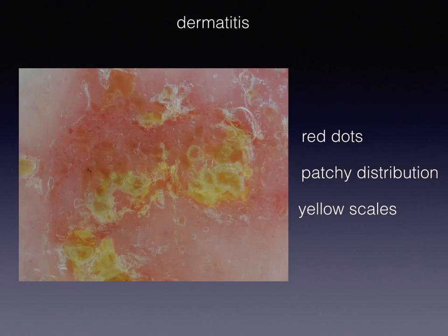Most importantly, the color of scales in dermatitis is typically yellow or white plus yellow, reasonably because of the underlying spongiosis and crust formation. Of note, this finding is valid not only in cases of acute dermatitis, but also in chronic forms, and this sign is very useful for the discrimination of the disease from psoriasis, which typically shows white scales.